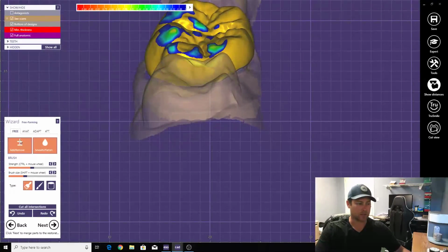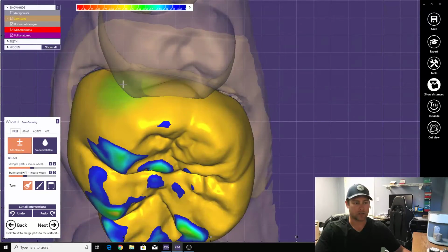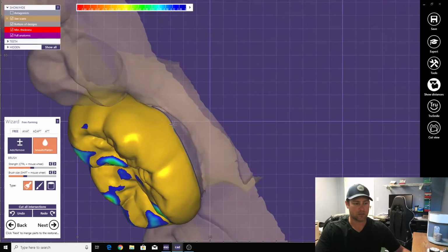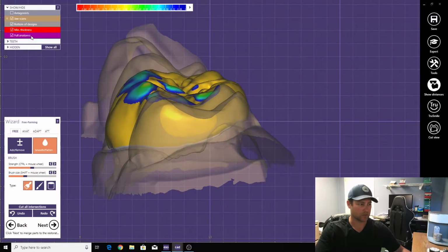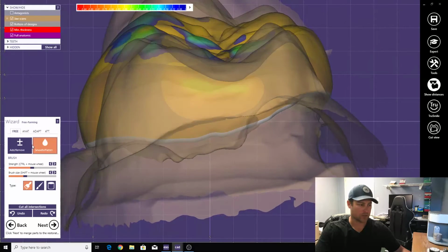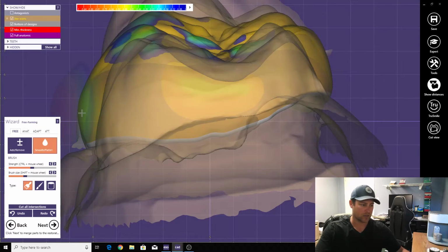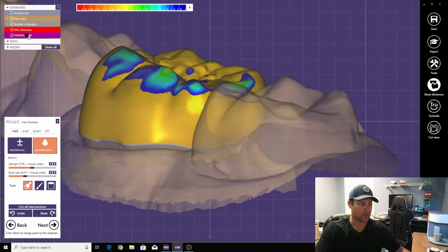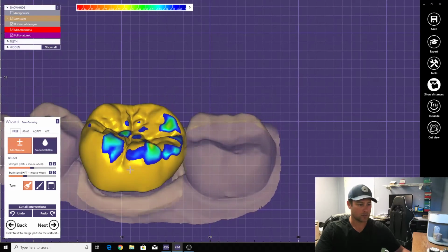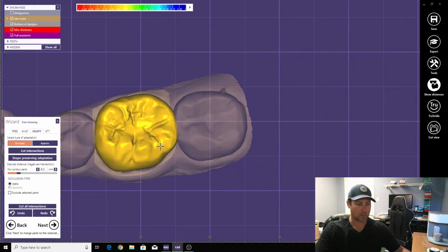Okay, let's make sure these contacts are, again, overdo the contacts. Alright. Okay, now we're going to, well, okay. So this needs to come down. This is the shift key again. You can see how fast it goes. Alright, let's cut it.